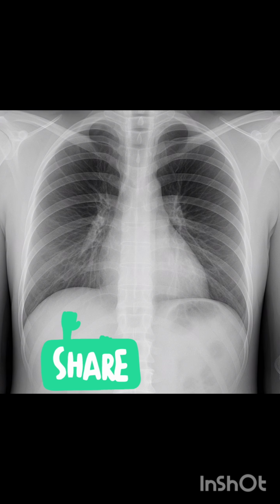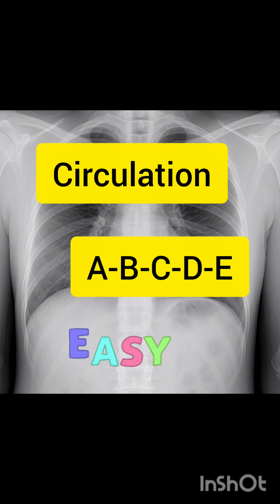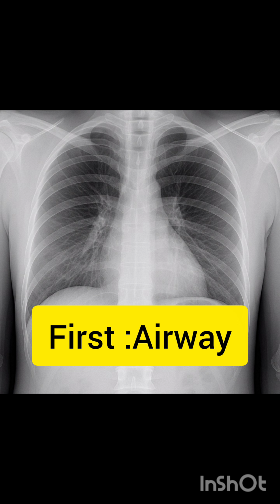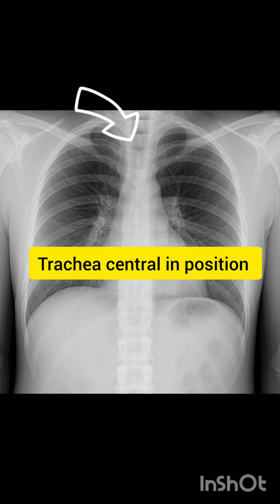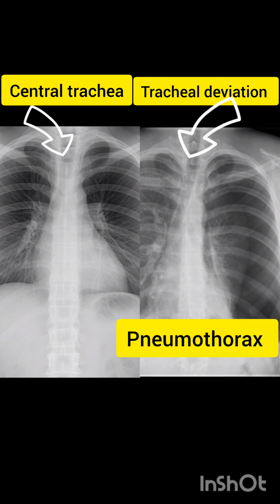Now the easiest and safest method: ABCDE, airway, breathing, circulation, diaphragm, everything else. Start with the airway. The trachea should be central. Look for deviation which may suggest tension pneumothorax, fibrosis, pleural effusion, atelectasis, or masses.